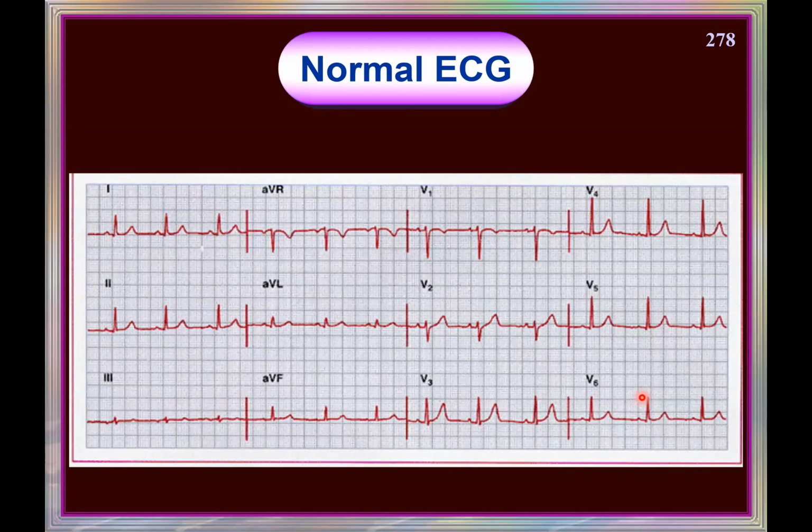So I'm showing you another regular ECG. As per our criteria, AVR is negative, V1 T is negative, V2 onwards not negative. R wave progression is very good, and the rate is 300, 150, 100, 75, or even less than 75, about 70. All are positive, normal axis, and the baseline of the ST segments is normal. Everything is correct, but the only thing missing in this ECG is the standardization.